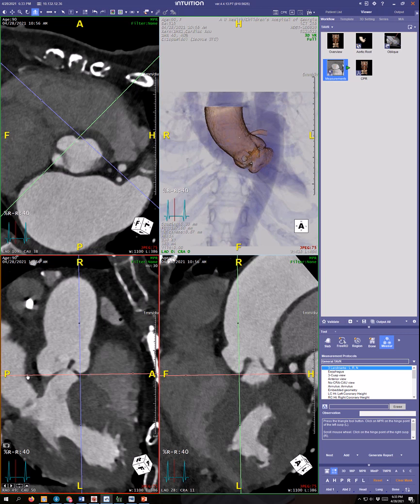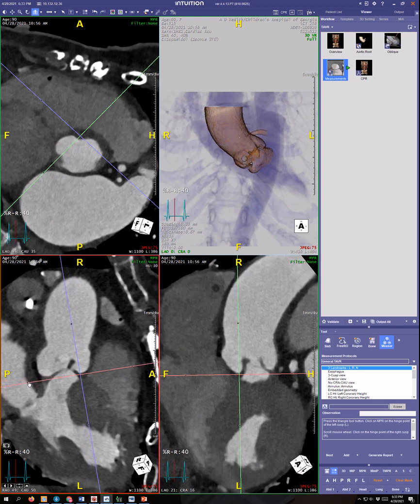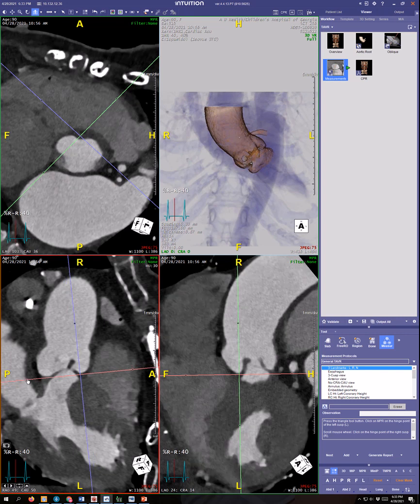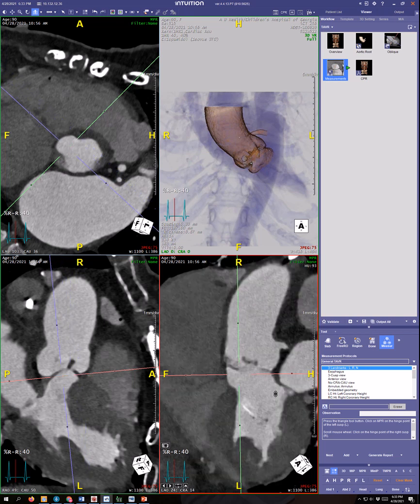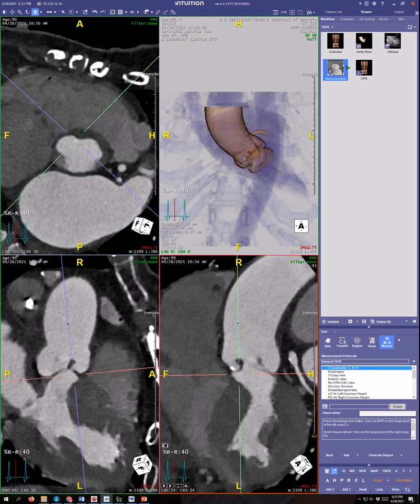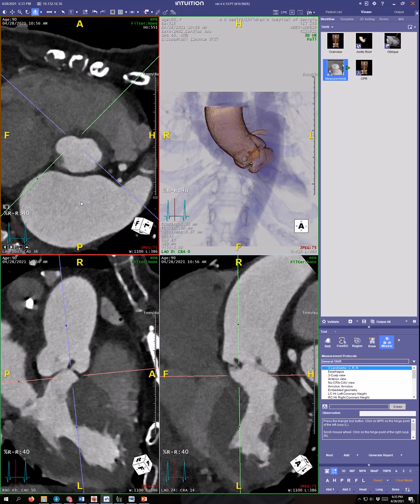Left mouse hold over the little circle and the little counterclockwise adjustment, and we found hinge point number 2. It's a little blurry for some reason. Let's put it there. Okay. Then in what is another double oblique MPR, formerly the sagittal window, I'm just translating back and forth to see where we are relative to the left hinge point, and we're about right on all of them here.